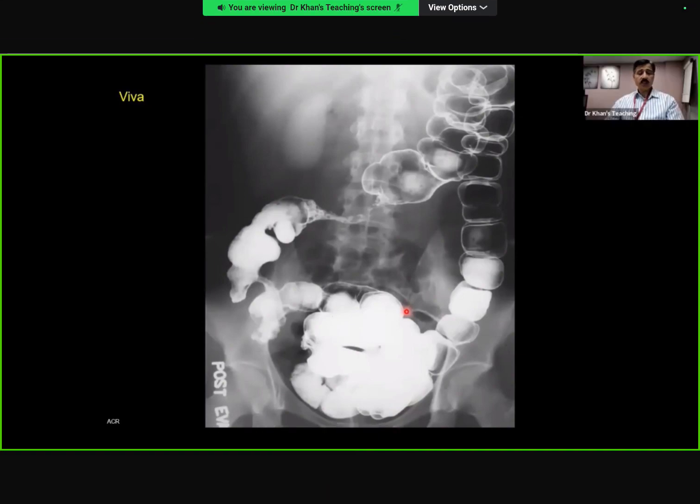Okay, this case is a more chronic case of Crohn's disease where you can see these fibrotic strictures here, and the idea was just to show you another stage of the same disease, and of course, is one of the pathognomonic findings. And please remember, as we have covered initially, lead pipe appearance is not fibrosis. That's different. And this is different.